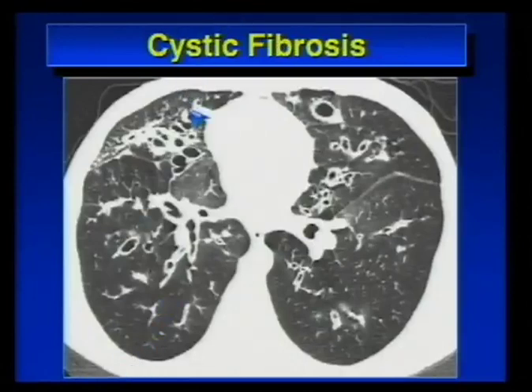Okay, so we can clearly see bronchiectasis, bronchial wall thickening. Look how thick the bronchi are here. And do we see anything else? Do we see mosaic perfusion? Well, look at the darker area here versus the lighter area here. So there is geographic mosaic perfusion, and that, as I said, can be seen in small airways disease, including small airways infection, as you see in cystic fibrosis. So bronchial wall thickening and bronchiectasis and mosaic perfusion.